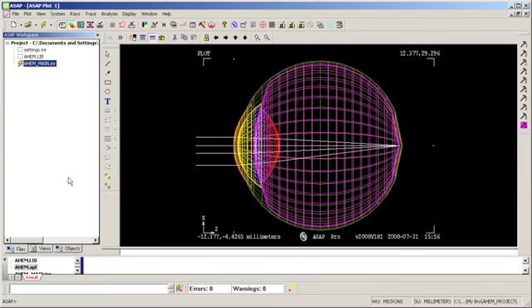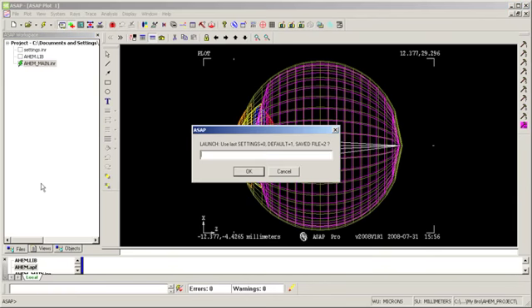All right, so it's very simple to start AHEM. We right-click in our workspace and start Auto Run. And we get a prompt screen. It's a launch screen. And it asks us three questions: a settings, default, or saved file. So right now I'm going to run the default model, but I do have the options for reloading settings that were generated before if you've been working on an eye model and you just want to reload it. And then also if you have a saved file from some previous session that you want to load.